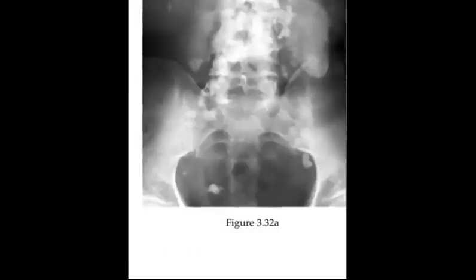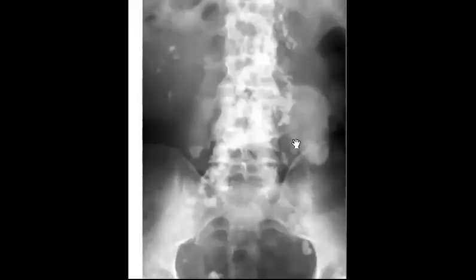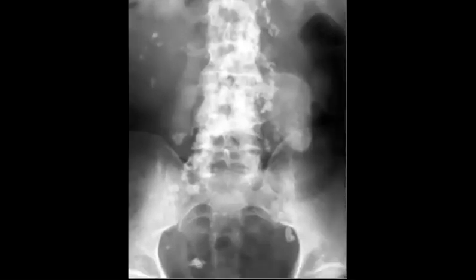I just want to show you something. When you mention that calcified psoas appearance in the MCQ or in the exam, most commonly it will be TB.